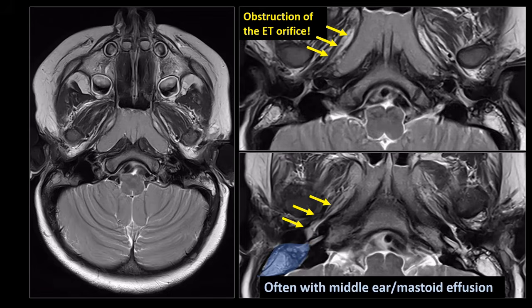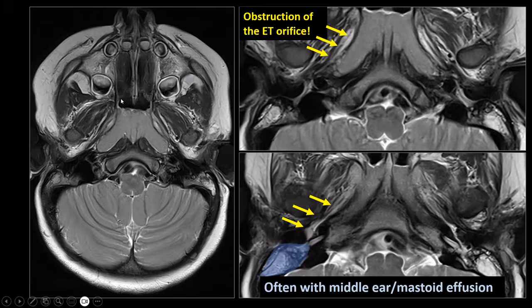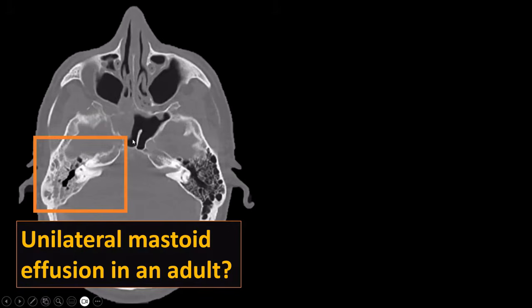Children can have conductive hearing loss as a consequence of that, and they are more prone to repeated infections of the middle ear. And in those cases, this nasopharyngeal hypertrophy becomes a cause of pathology. So it can be an incidental finding in asymptomatic patients or a cause of symptoms. Then, what do you also have to recognize in adults? That is a nasopharyngeal carcinoma.